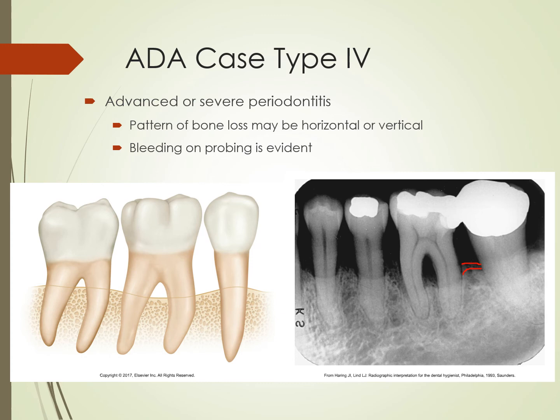And so this is where that level should be. So this is the bone level we're seeing here. I'm seeing a little bit of bone as it kind of creeps up over here. So this area here versus this is where the apex of the root is. We're seeing almost close to 50% bone loss on this one surface of this tooth. Now, if we look at this one, this is where the bone should be, because the enamel ends right here. And then this is where the bone is on one side. That's where the bone is on the other side. Here's the tip of that root.